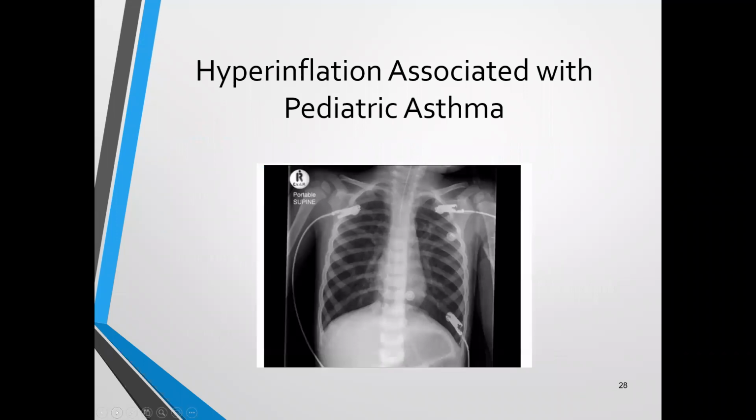Hyperinflation associated with asthma. So this is a pediatric patient. You're seeing big rib spaces. If you guys don't look at a lot of x-rays, you can't look at this and say, well, this looks pretty normal to me.